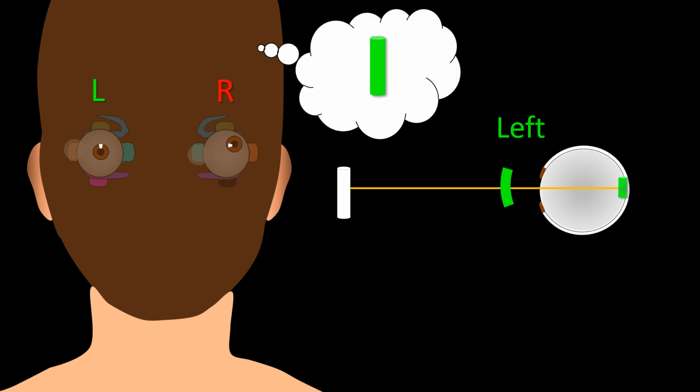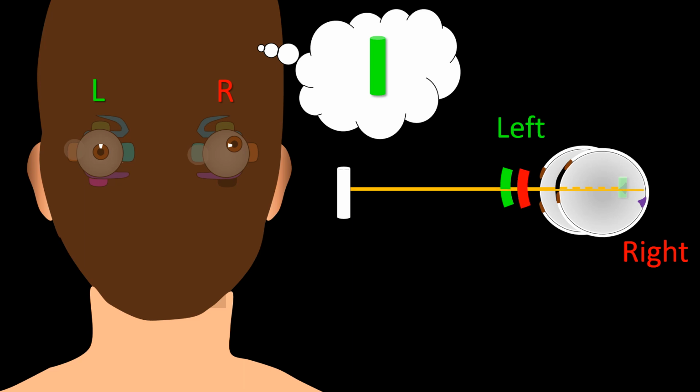Now let's uncover the right eye and represent it, but not in the normal position as shown in this frame, but hypertropic as represented here. So in a hypertropic eye, the image meant to fall in the fovea at the eye equator will fall in the upper part of the retina as indicated here, and thus the red bar will be captured at the upper retina and as a consequence represented below the correctly placed green bar.